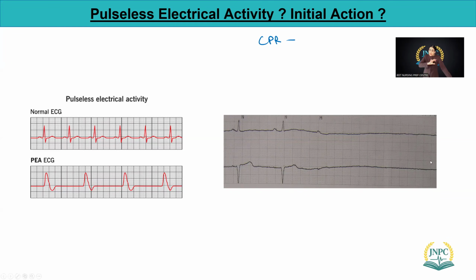Okay, so we are done with that. Now the last part is just a quick activity time. Let's see how much you know. I'm going to show you the rhythm. You have to tell me which one it is and what the initial action will be. Okay?